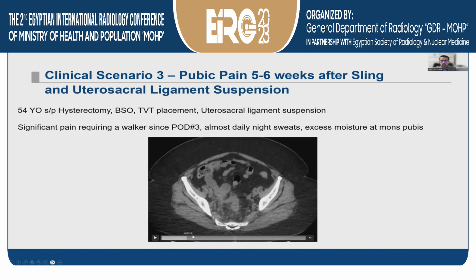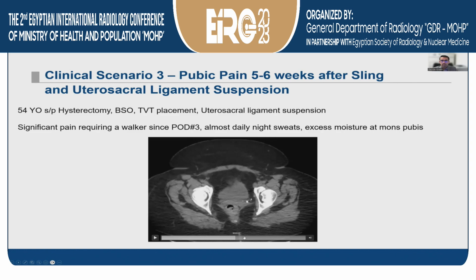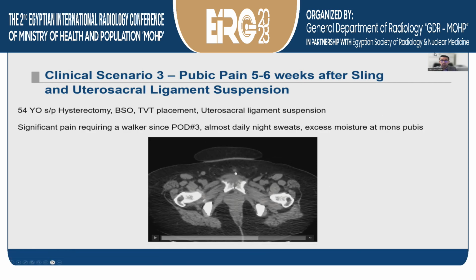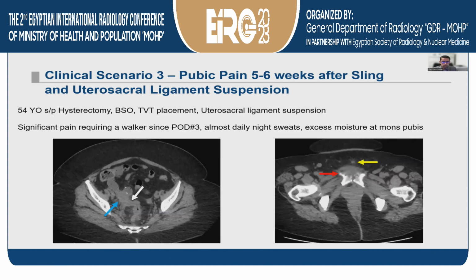So here's the asymmetric thickening on the right in the pelvis, maybe involving the rectum, and then as we keep coming down, we see this tubular structure that's going through the rectus abdominis, going right on top of the pubic symphysis, which has a lot of soft tissue and erosions, but this structure extends into the mons pubis and to the skin surface here. So again, the static image is showing the abnormality along the right side of the pelvis and the erosion of the pubic symphysis and this structure going right next to pubic symphysis extending into the mons pubis.